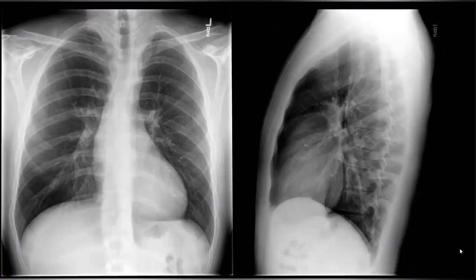This radiograph looks deceptively normal, right? Whenever you have a normal radiograph, what do you want to see? We have to look at the hidden areas, which would be the retrocardiac region and the bones. There's nothing in the bones. And what do you think about the lateral radiograph? Does this seem abnormal to you?